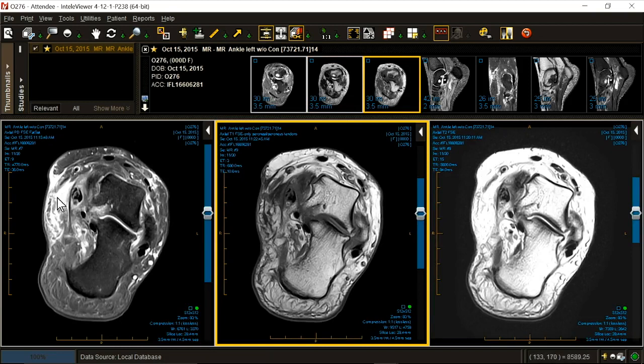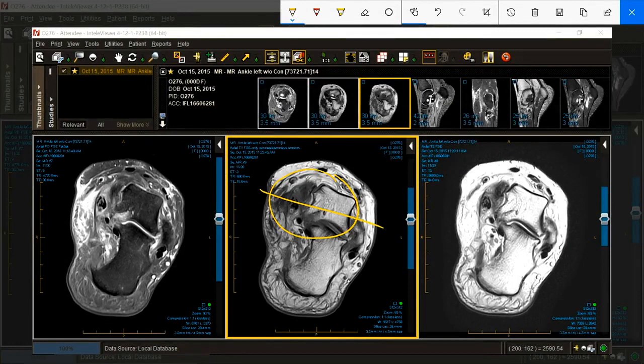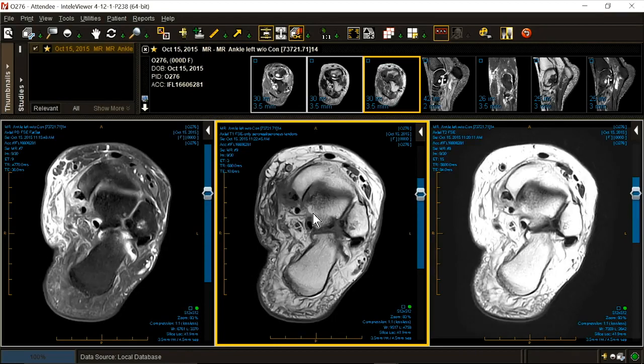Now it has split into multiple fragments. So it's a big longitudinal split tear. Remember what a split is? Split through and through. Half the tendon, delamination. In the tendon, intrasubstance delamination. Terminologies you need to learn. Keep going. Keep going up.